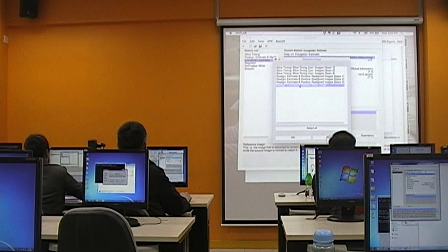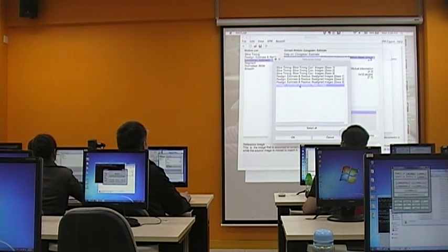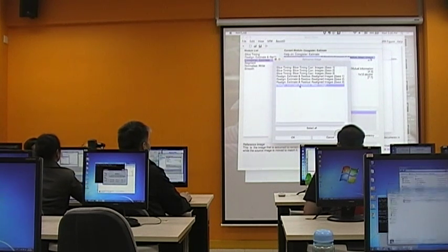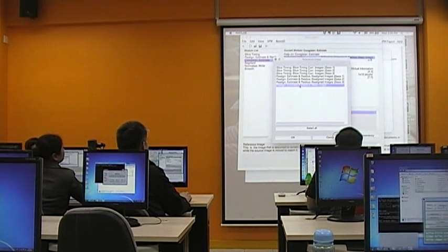It could be the T1 also, but if you choose the T1 as the reference and the source you use the mean image, then you need to also write all this transformation onto the EPI files, because this time you are keeping the T1 structural image stationary. You are trying to move around the mean image to match with the orientation and direction of the structural T1 image. So then, you are only moving the mean image. You are doing nothing to the functional ones.